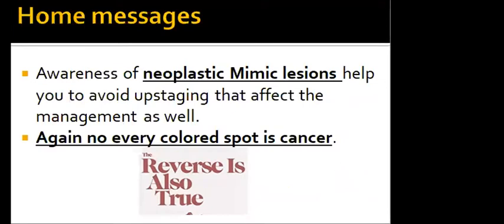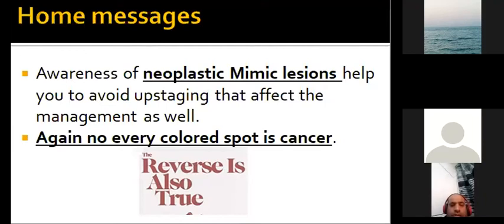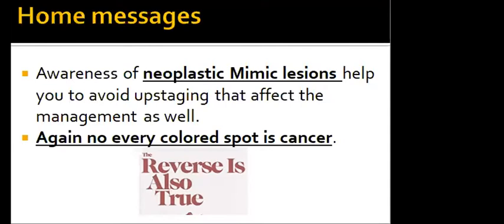Yeah, that's a good question. So you should make a follow-up. For example, in true practice, you say that it could be metastasis, it could be Paget's. You need something: either you have to check the previous images or to request follow-up in this case.